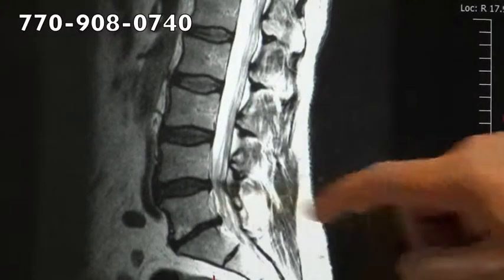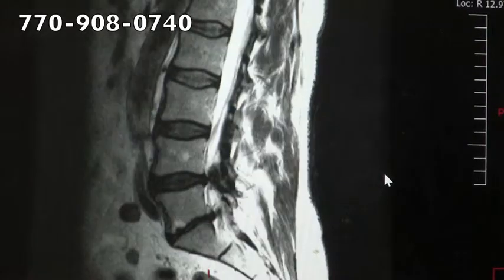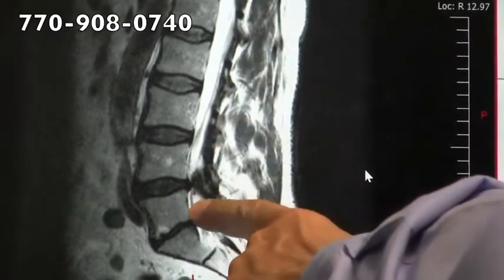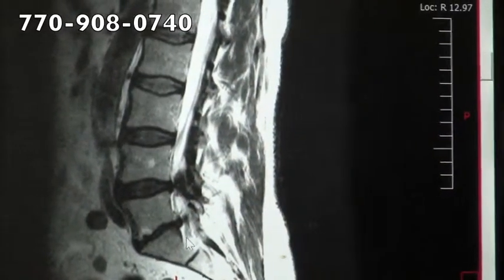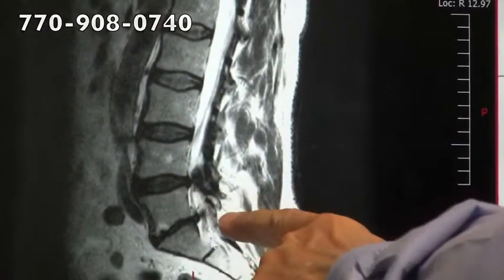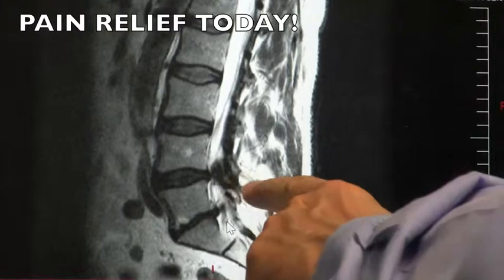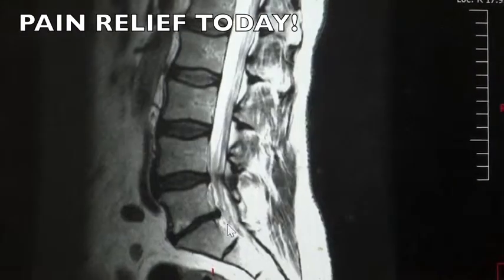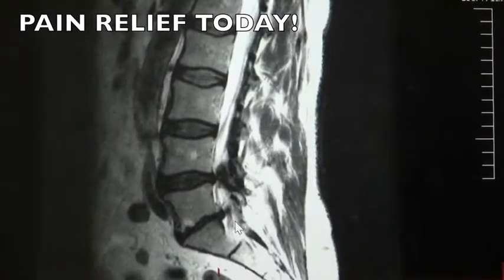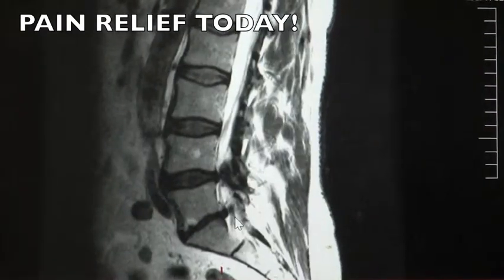However, if you look right there, I'm going to switch now to different slices. If I go to that slice right there, you can see there's some ligamentous tissue right there that makes the canal more narrow at that point. You can also see right there the little bit of disc bulge at L5S1. This is the L4-5 disc. It's bulging out a little bit back there, but then there's this greater mass of soft tissue that's dark in color also. That is the yellow ligament. That's the color it is in reality. On here it looks dark in color. So that's narrowing the canal at that level. Not so much in this slice, but in that slice.